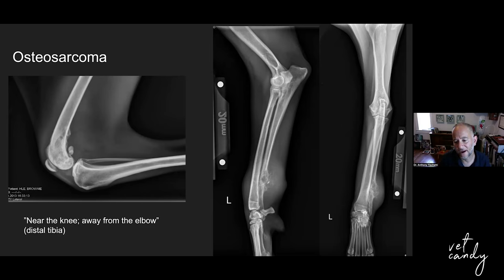And we're just looking for various amounts of bony lysis, okay? You'll hear us talk about a long zone of transition between normal and abnormal bone. This looks very abnormal here, and then it just takes forever for there to be normal bone. Irregular periosteal reaction and cortical thinning, very important. You see it very nicely in this ulna, where it just blows out from the lateral cortex and the caudal cortex. Very common to also see a soft tissue component to these aggressive bone lesions, okay?